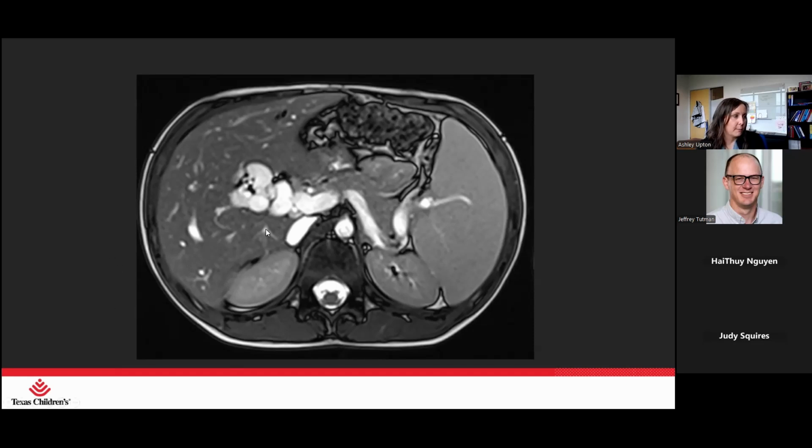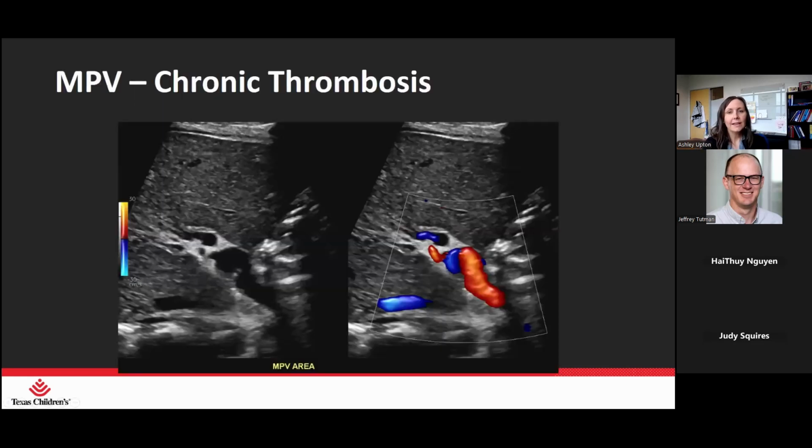And as a caution, portal vein collaterals can be numerous, tortuous vessels like what's typically seen, like what I've already shown, or they can sometimes be just one or two larger collaterals that can mimic a native main portal vein. It's a really good fake out. A clue that it's probably not the main portal vein is that it will still be just a little bit tortuous and not completely straight like an actual native main portal vein. This is a patient who did have just one nice collateral, but you can see how it kind of turns a little bit towards the hilum of the liver.